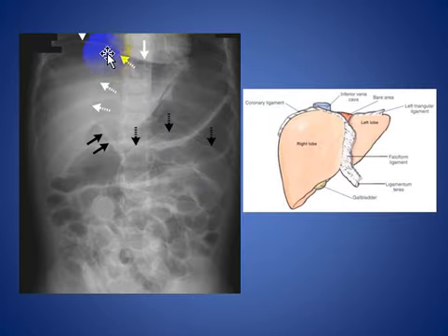Also, we see the air under the hemidiaphragm and extended to the midline with lucent liver sign.